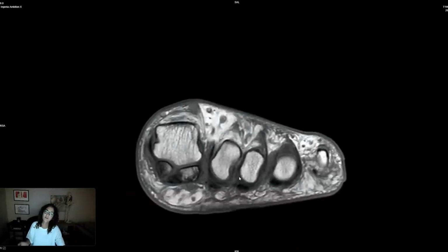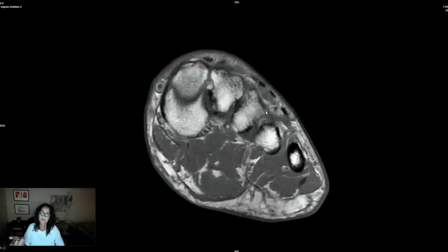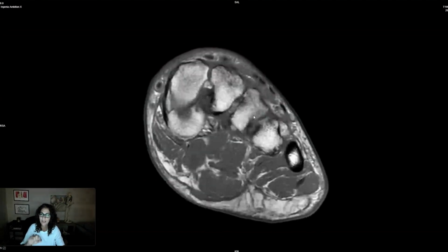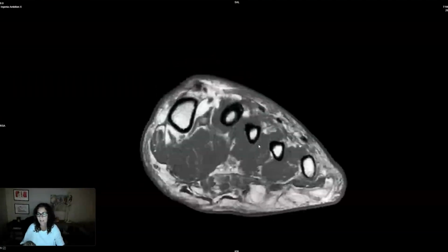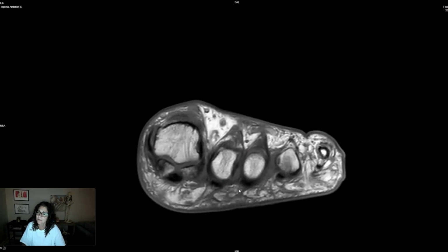When I look at the forefoot parabola, notice that there's a flattening or an inversion. So if I use my schema thinking that there is some compression of this third metatarsal between my Roman arch, and that's adding to my biomechanical disadvantage, then I would expect there to be some kind of plantar capsulitis where my third is really landing. Now, it's not a dropped third metatarsal head, but it's subtly flattened, and there is some mild reversal of this parabola. So these guys are really under a lot of stress.